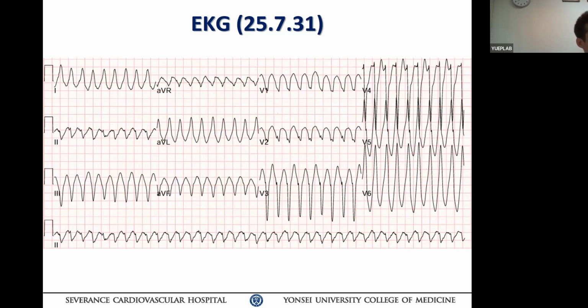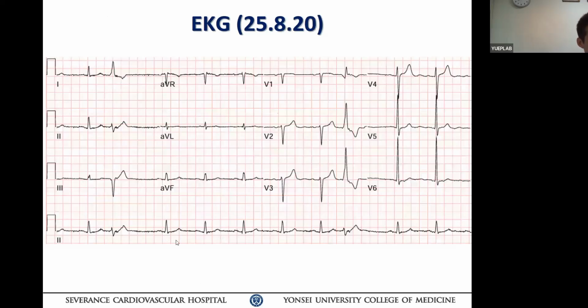The most interesting thing is that when you go back to the sinus rhythm ECG, there is no obvious Q wave. Suppose that, yeah, there is no obvious Q wave, and also your VPC morphology was slightly different from your VT.